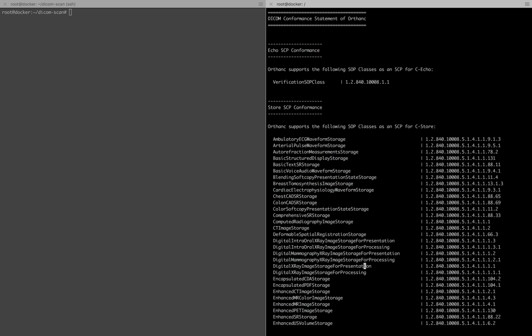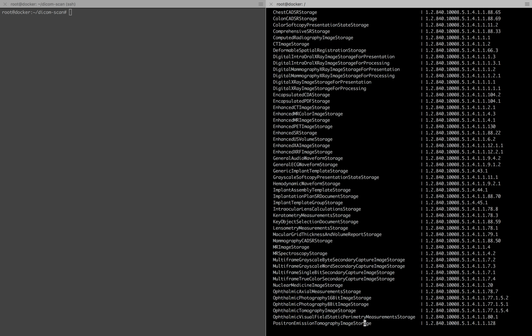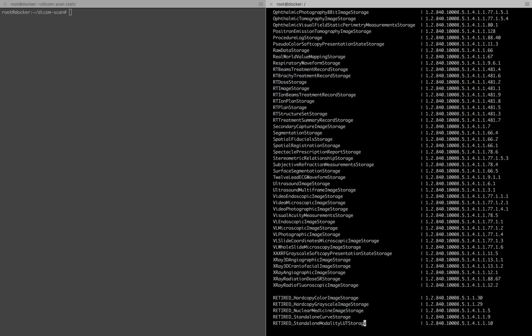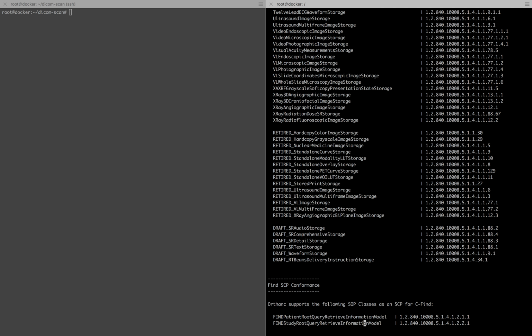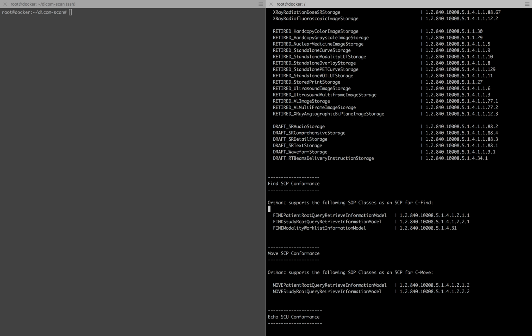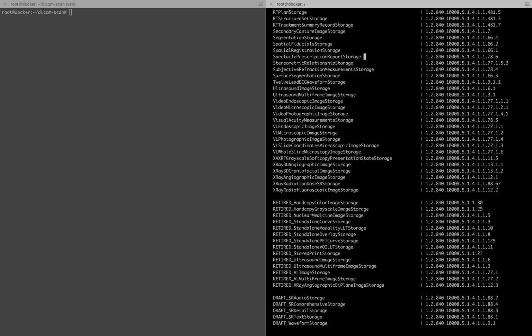And considering the application entity title with native DICOM is kind of a big thing since there's no username and password, what I've been able to identify, at least with cecho, is I can use these commands, or these OIDs rather, instead of using an application entity title name, and be able to talk to DICOM from my client, which is very interesting.